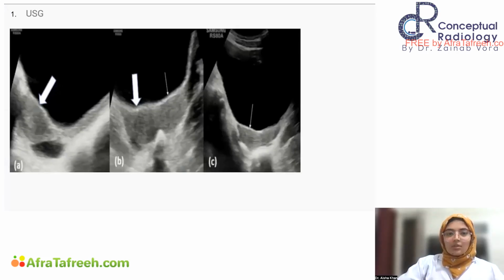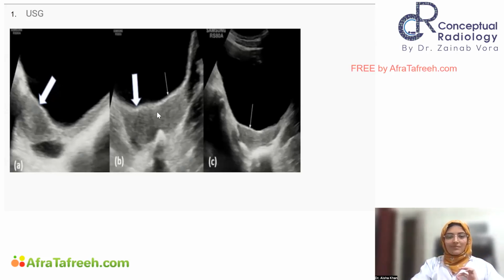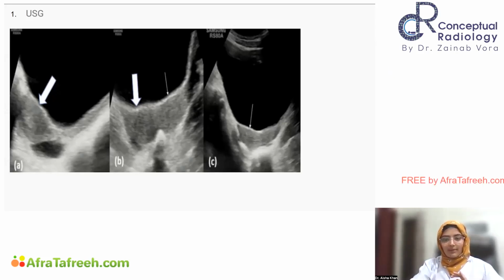So this is case number 1. इसका sono image है. You can see एक ये चीज़ है, ठीक है? I am just helping you quickly. और एक ये चीज़ है. So there is one thing here, one kind of cavity. There is something else also. Okay. Sonography image. MRI पे it will be more helpful. देख लेते हैं.